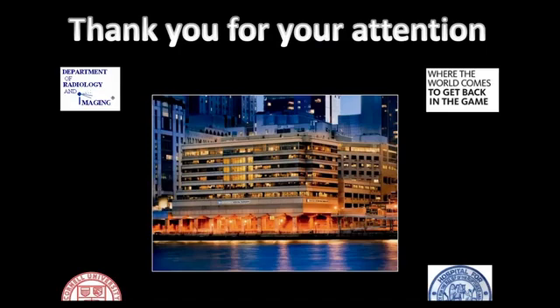let's see if I can find it. Is my screen still projecting? Yes, it is. Okay, so can you see this image here? Yes. So that degree would suggest that that is wider than normal. So that's not a small effusion. I wouldn't categorize that as a small, like a drop of fluid. So when you see this, I agree with the surgeon. This does indicate that there's some instability, often demonstrated on an upright radiograph, as you see in the next image here.